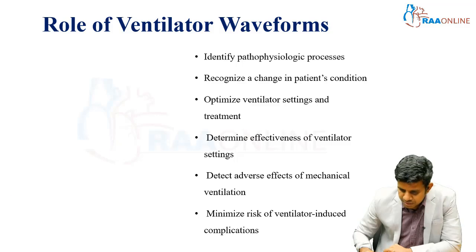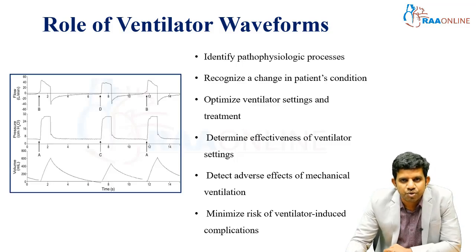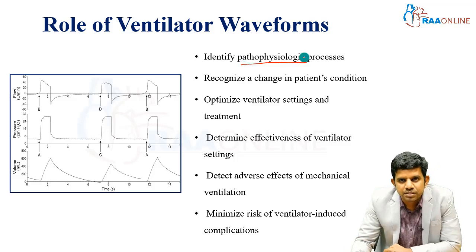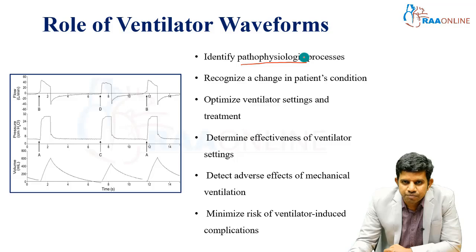Next, what will you do with the ventilatory waveforms, and why do the modern ventilators give continuous information about the respiratory mechanics? From these waveforms, we can understand the pathophysiological process. Whenever a patient comes to you with COPD, the waveforms will be different, like auto-PEEP or increased time constant. These are the common problems we face with patients with obstructive airway disease. If it is ARDS, the time constant will be very short. It is a compliance-related problem. Our ventilatory settings will be different.